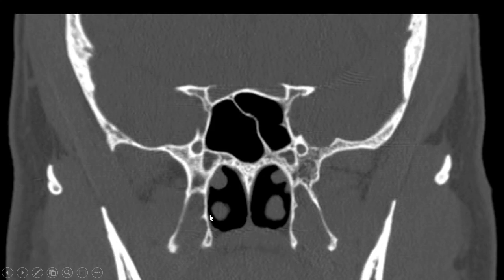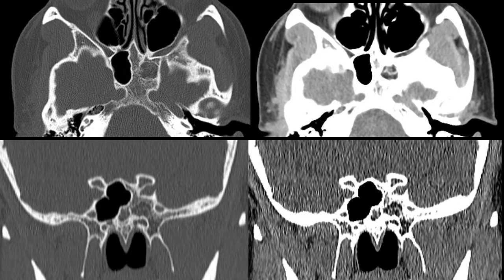First, we'll focus on lesions centered within the bone of the skull base, primarily consisting of lesions centered within the sphenoid, particularly within its midline. So this is the first case, and what we see is an area of rounded, decreased attenuation in the body of the sphenoid. Note that it follows fat attenuation and has relatively sclerotic borders, but is not expansile.